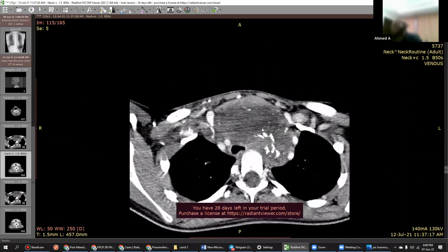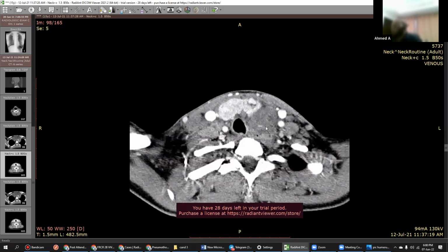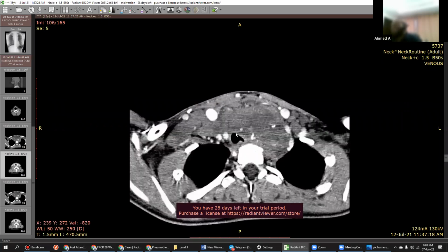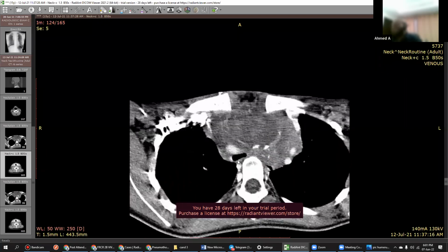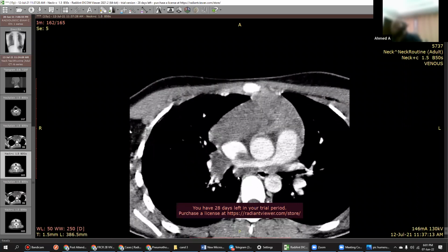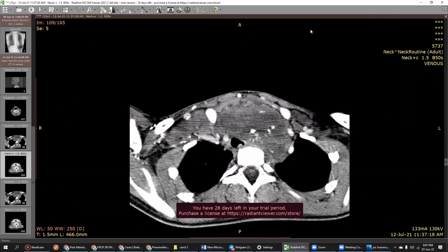That's how the CT helps, right? Because the calcification part we were not seeing on the chest X-ray and all. And also you have to comment on the tracheal compression and all. The patient might require intubation and all those things. If you say, you'll get more additional marks. Okay, so these were your cases.